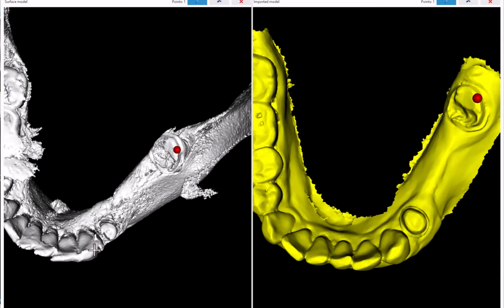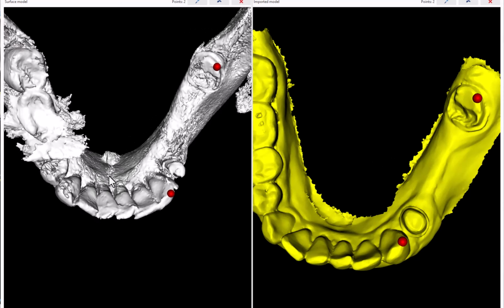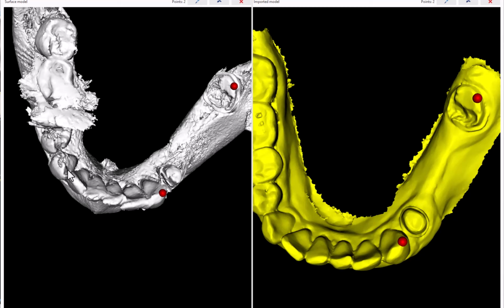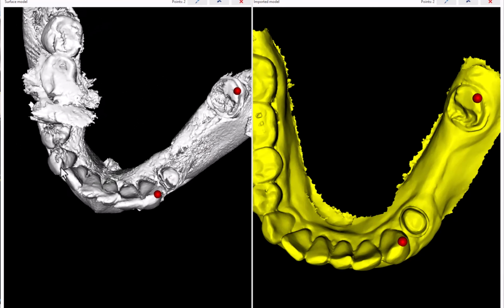You always have a lot of scatter, so that's a pretty clean spot on that cuspid. I can always find the spot on the right hand side of the screen. It's finding good points over here that's kind of critical. So I kind of like this area of the cuspid here.